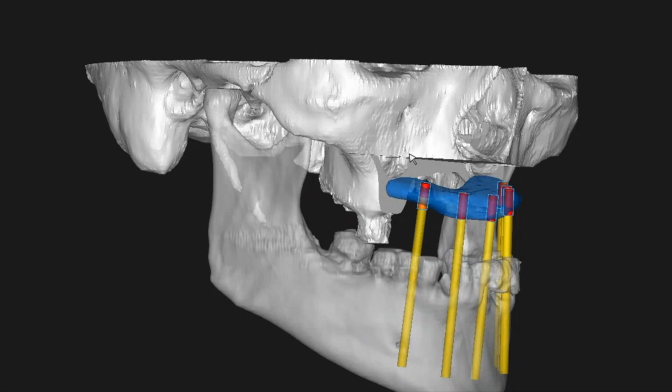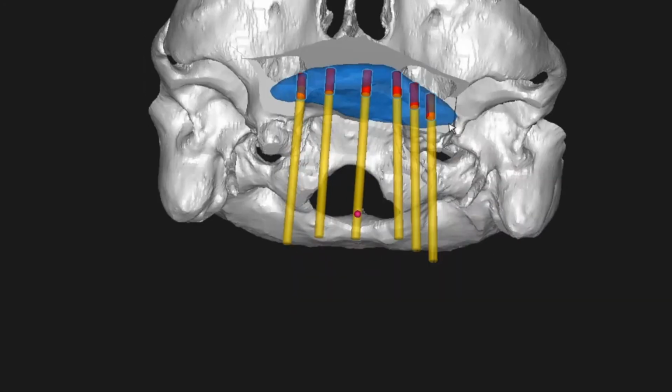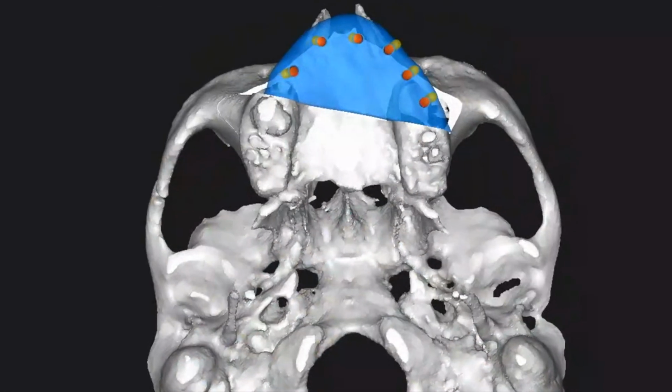All right. I think that's everything I need then. Anything else you wanted to review for today or any other questions? Oh, one final question, I guess, is regarding the dental implants. Did you also want an occlusal-based guide for the location of the implants on the scapula? Or do you want that incorporated into the scapula guide design? No, I think if I have an occlusal, I prefer that. It just gives me a bit more flexibility.